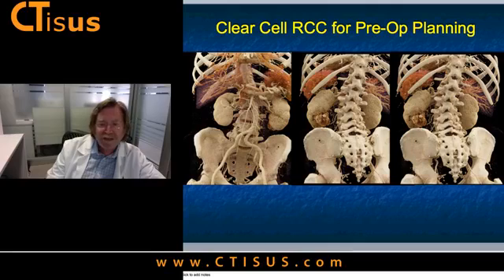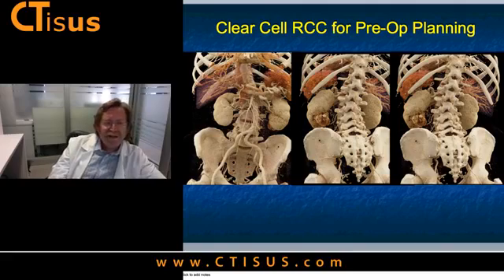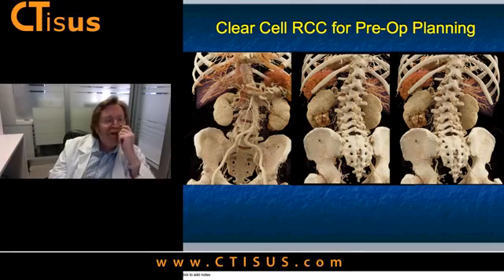So everything is post-processing. I personally do all the post-processing, so it's not something I think that a tech can do, though obviously you can train technologists to do that. I think it's the radiologist who really needs to know what it is you show. So I do the classic volume rendering, I do the MIP, and then I do the cinematic. In the cinematic, I focus on some of the things I need to answer or show better. I think if I had to pick one thing about the cinematic, it's really that preoperative planning. It's what the surgeon really needs to see and the surgeon really wants to see.